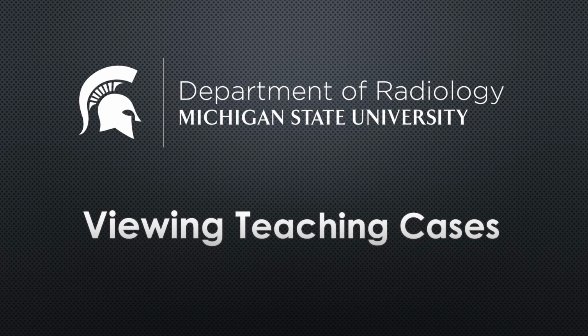Welcome to the MSU Radiology Teaching Cases system. This site contains over 10,000 teaching cases submitted by radiology residents and MSU radiologists. This video will cover the ins and outs of viewing cases within the system.